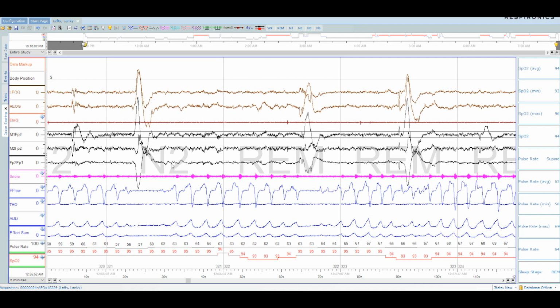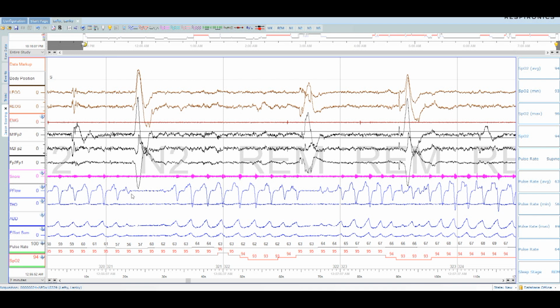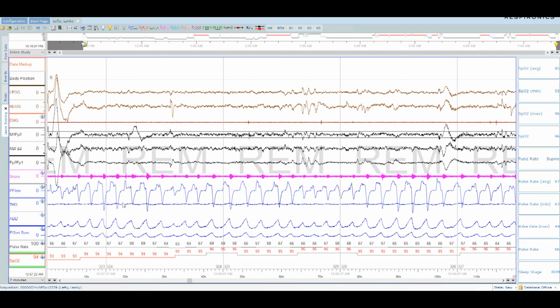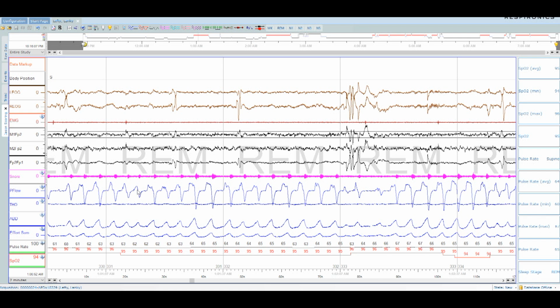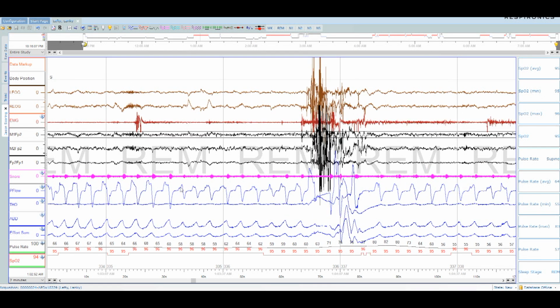Now looky here. What do I say about REM? Looks like REM actually starts over here. Central apnea. Central apneas are seen in REM sleep. It's a normal part of REM. I have said this during, again, my PAP therapy analysis. These aren't long enough, but in general, you can see they really don't do anything. Like they don't wake people up. There's no arousals. Rarely blood oxygen desaturations. Just the breathing changes in REM sleep.